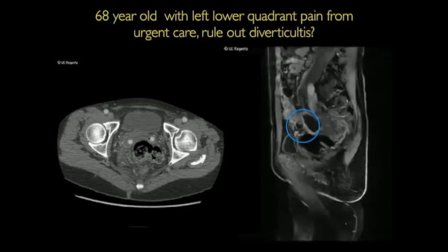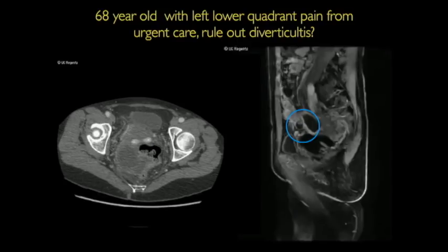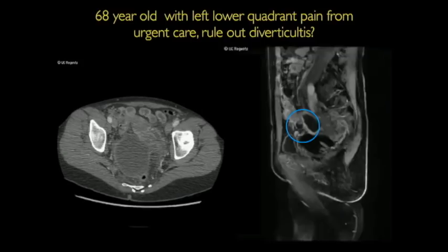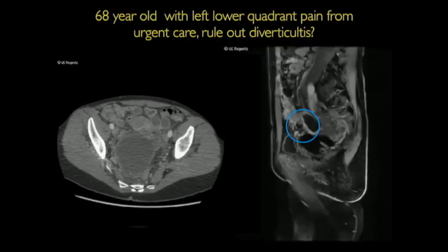It would have been quite difficult to evaluate in a postmenopausal woman to figure out what's normal ovary and what's going on. And so, again, it can happen in postmenopausal patients, and if the lesion is large, consider doing an MRI to find the vascular pedicle.